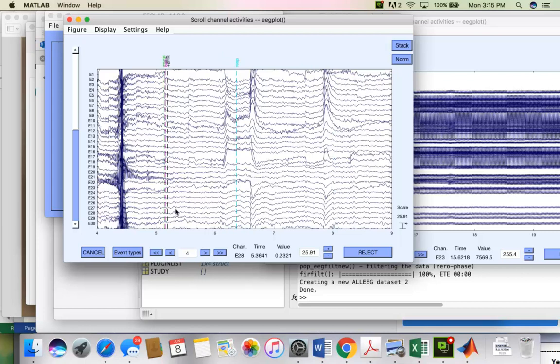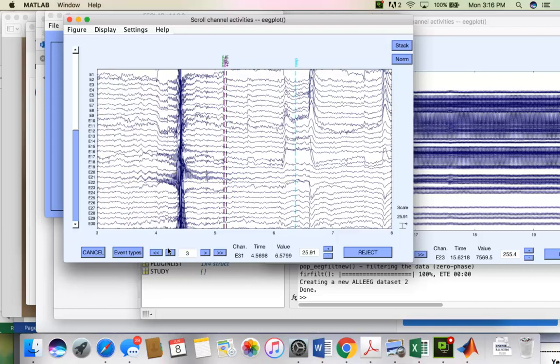So what we want to do next is look at a way to get rid of some of these artifacts. The first thing you can do is page through your data, or sort through your data, and select it on the screen.